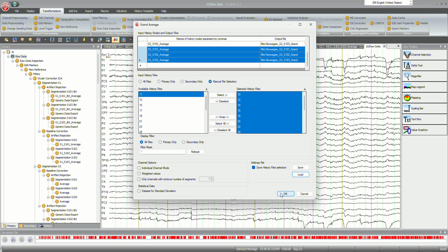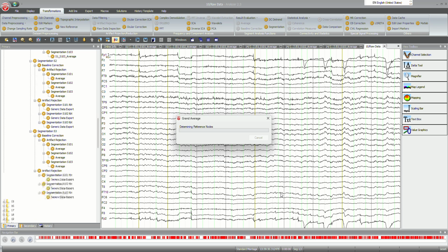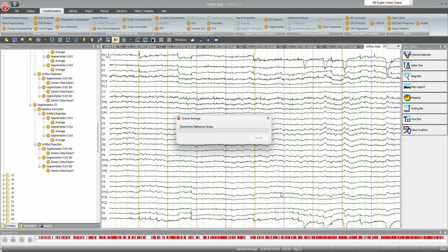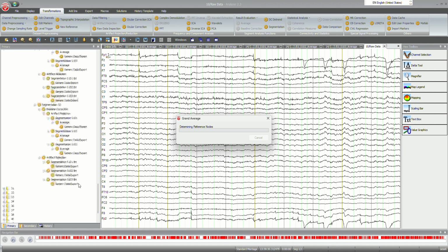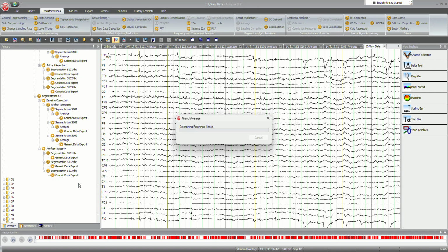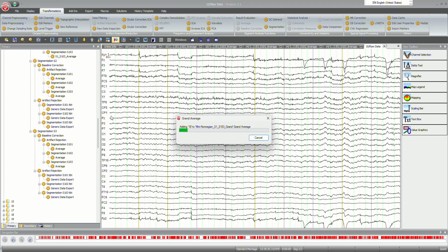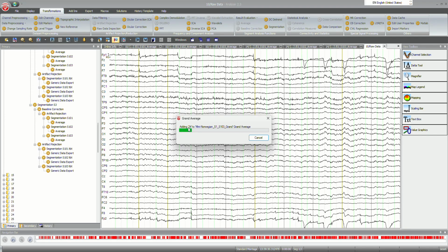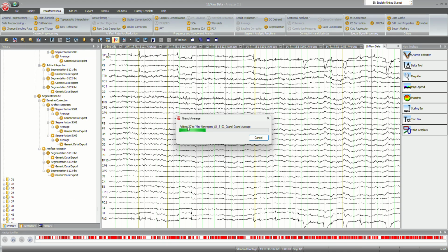Okay, so with that we can continue, and now this will take a little. As you can see, this is scrolling down across the participants, determining, so you can see here that only the even numbers, which correspond to men in origin in our case, are being selected.